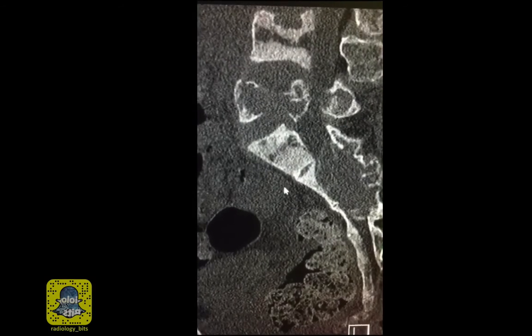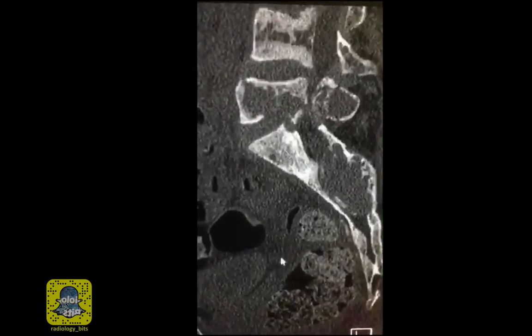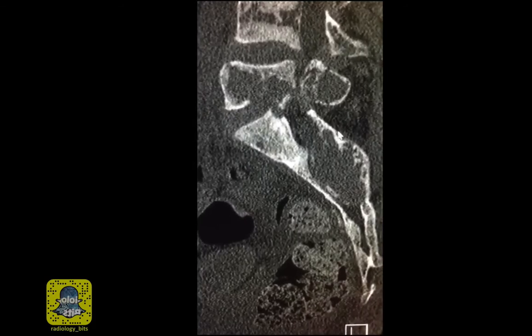Now to something more interesting for the senior audience. I showed you the sagittal reconstruction of the pelvis. You also see how the brown tumor at the sacral region extends into the spinal canal. There is a diffuse involvement of this fifth lumbar vertebral body with subsequent pathologic collapse.